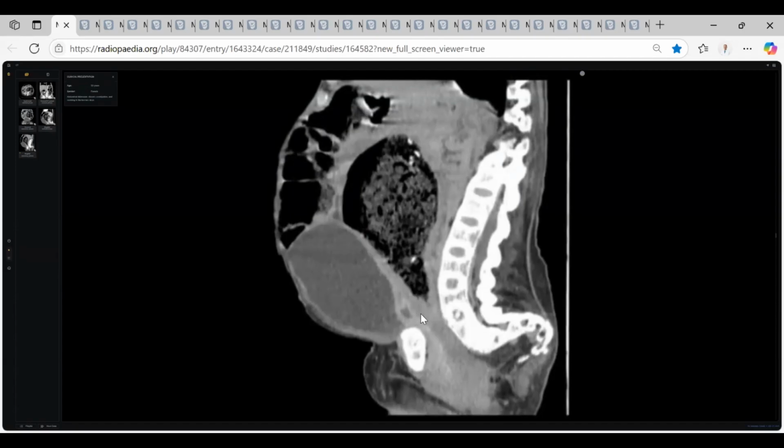Could you detect any mural mass? Frankly, no. See, all the rectum is homogeneous in thickness. So at least keep in mind it may be something neuronal. If you told the examiner it may be a mural mass, but I told you this is chronic, so if you told the examiner it may be an aganglionic segment, doctor, I suspect adult Hirschsprung disease, but it is very rare, the examiner will be very happy.